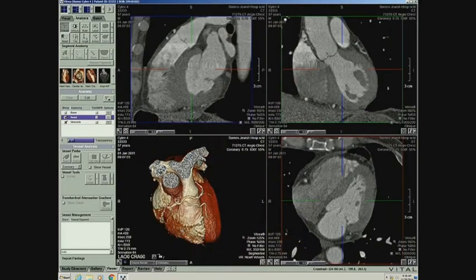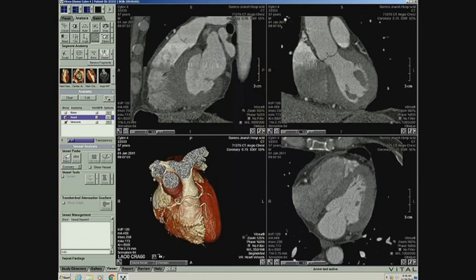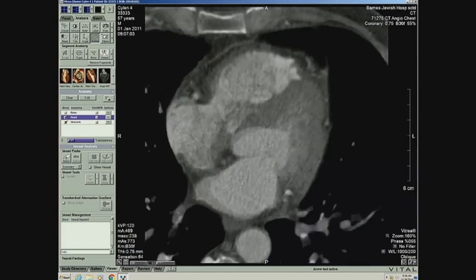Starting out with just looking at this 3D rendering, we can see there's something abnormal, because here's a right ventricle, and we shouldn't see much anterior to it. Now, we know the conus branch of the right coronary artery could travel anterior, and Dr. Agarwal showed you a very nice anterior collateral pathway when there's a Vieussens arch, but here, we have to see what's going on with the root, with the course again.